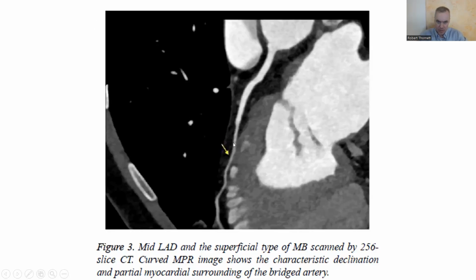at the bottom here, not only does it get narrowed suddenly, but then it gets opened up suddenly too. It gets unnarrowed, right? It gets widened suddenly as well, which tells you that it wasn't just an artery that was naturally narrow at the end, because if it wasn't, why would it become wider again? And then it's also nice and light, and then it becomes sort of blurry in the middle here, darker and fuzzy. And then the third telltale sign, the black fat stuff, disappears right in here.